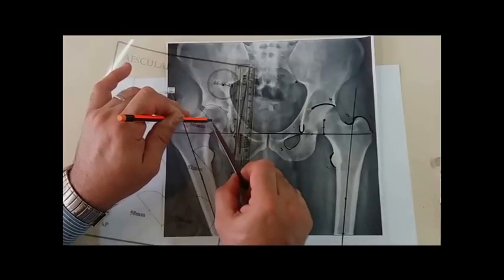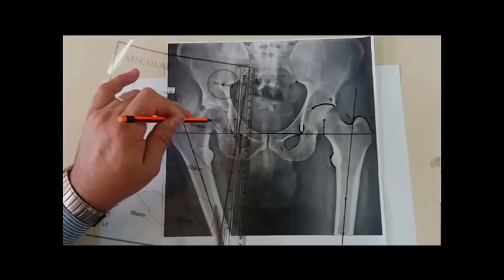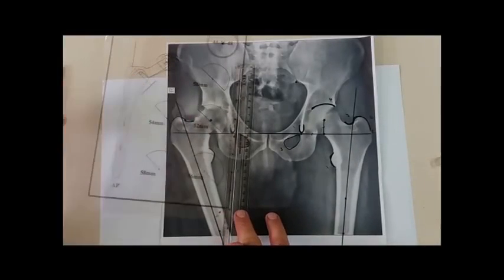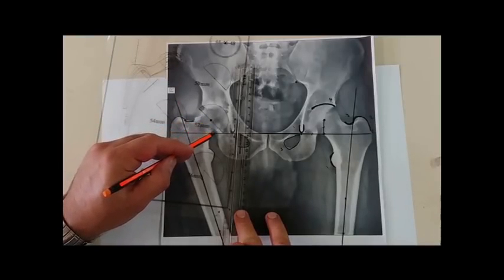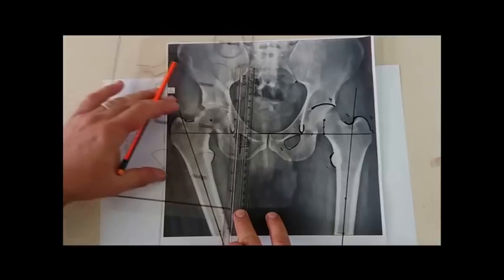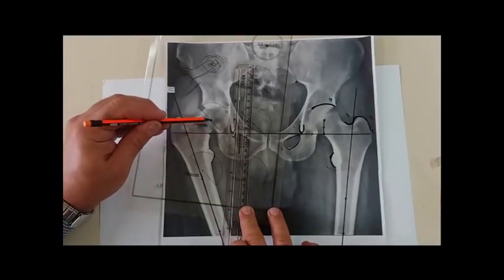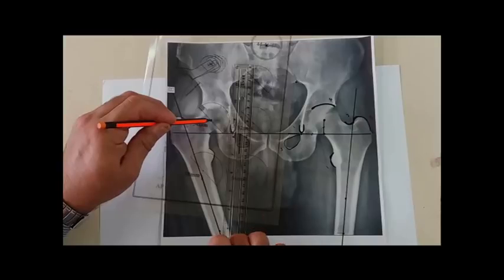Of course, when I put this size, for example size 50, some part of the acetabulum is not reamed well, and I still have some space to ream. So I will go to upsizing. From 50, I will go to 52, coinciding the center with the center. The angle would be 45 degrees, and see what is going on. Still, we have some spaces here. We can go to the upsizing, which is 54. With the 54 also, I match the center of rotation of the template with the center of rotation of the radiograph, and incline the acetabulum 45 degrees.